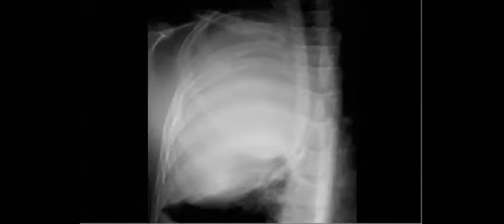Perfect. So it is not pulmonary. I think it is chest wall. Perfect. So at least it will not be pulmonary. So you are talking about either pleural or chest wall. I agree with you that it will be chest wall. So when you find chest wall involvement in a pediatric patient, what is your differential now? Start with everything: congenital, traumatic, inflammatory, neoplastic, until you reach Ewing sarcoma.